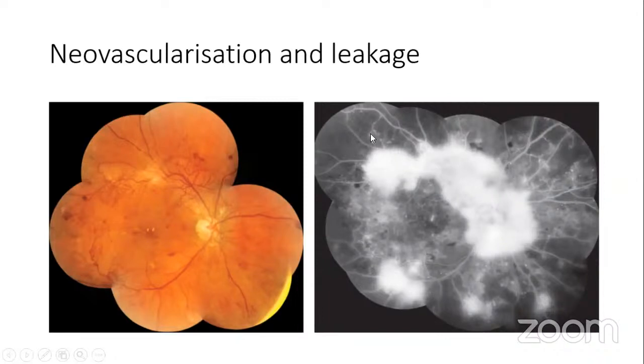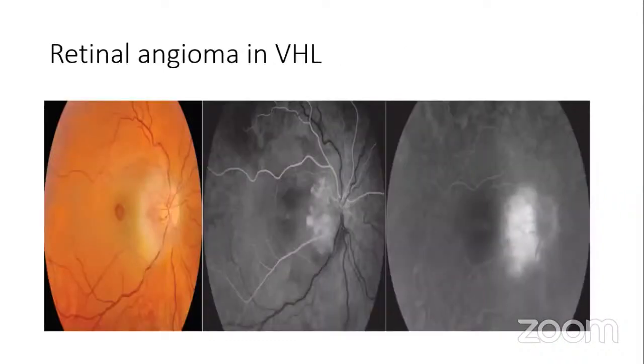And you look at the general angle, these regions are dark. The concentration of dye within the vessels has diluted in comparison to the fluorescence you're seeing here. Look at it. These are around your late phase or recirculation phases. And you have leakages here. The dye is meant to be in the vessels and should have diluted at this time, but it leaked out, and intravascular flow cannot clear it out at this time. So you have leakages with neovascularization.